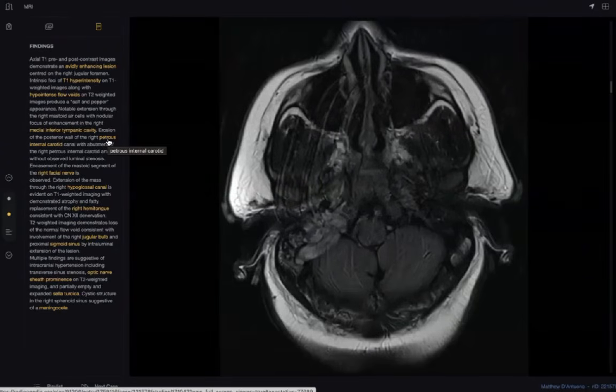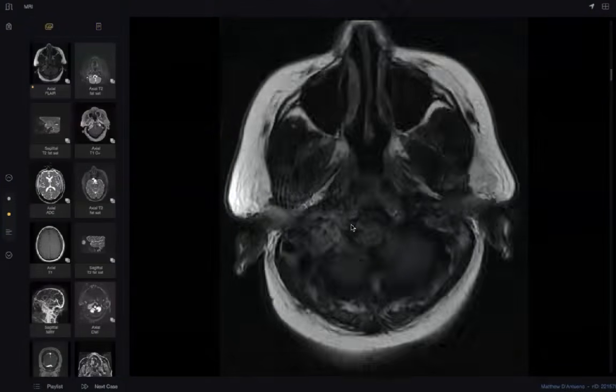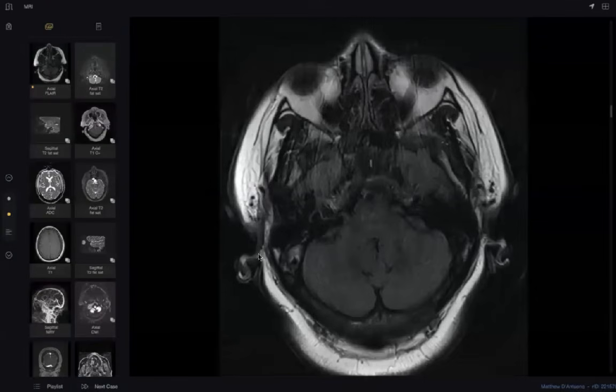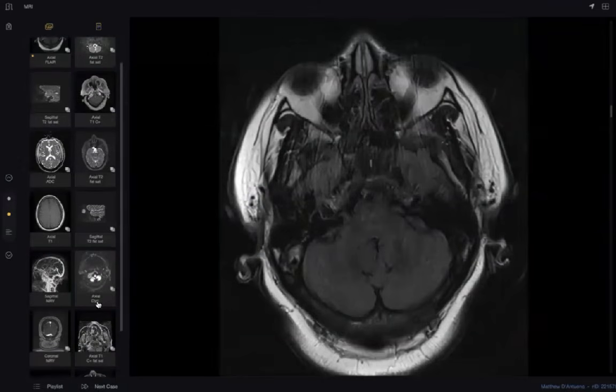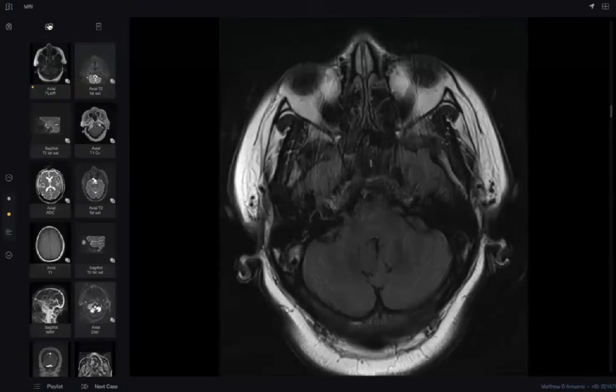In my opinion, if you told the examiner it is mainly jugular paraganglioma, I think it is a very good answer. Okay, my colleague. Somebody is asking, Doctor, why are there many findings here in Radiopaedia that our colleague didn't mention.